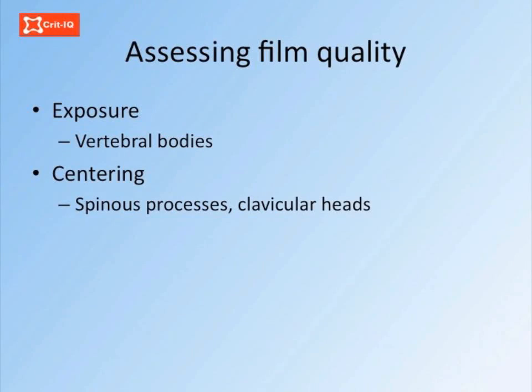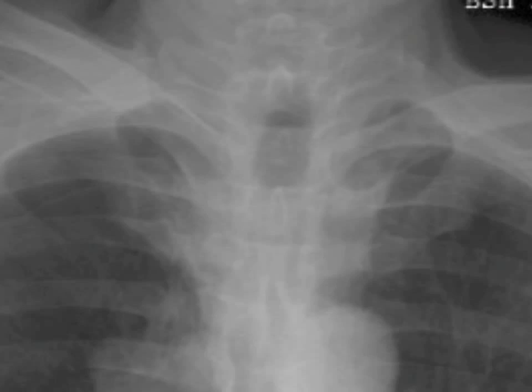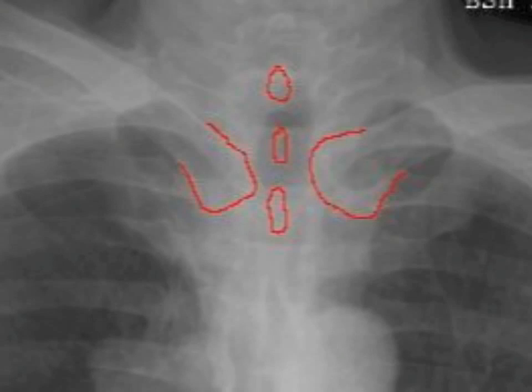The thoracic structures can appear different if the film is not taken from directly in front of the patient. A simple trick is to look at the spinous processes of the vertebral bodies, which should be halfway between the ends of the clavicles as shown here.